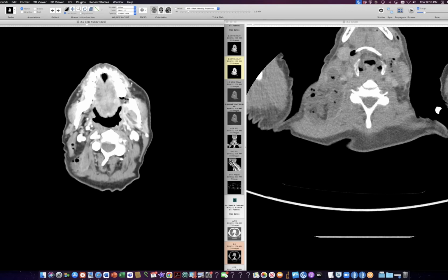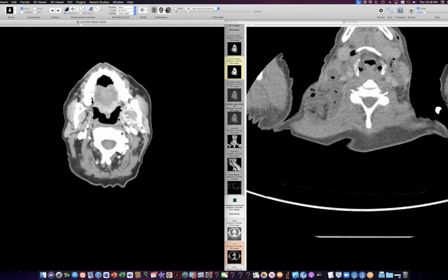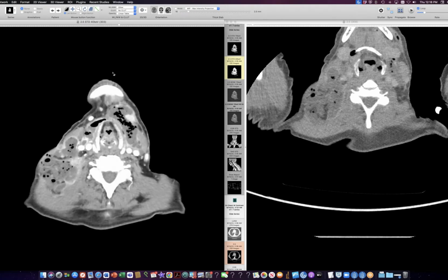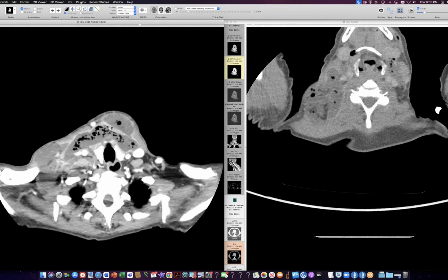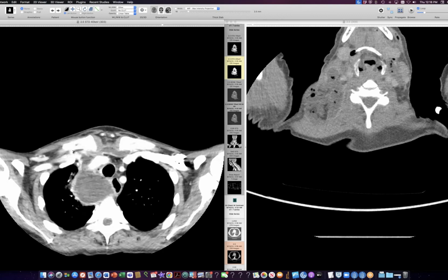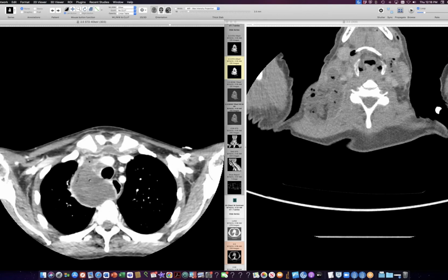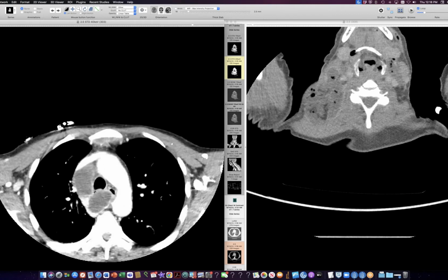So this person had an extraction on September the 2nd because of an abscessed tooth back here, and was given some antibiotics, which he said he took religiously afterwards, and then noticed some facial swelling, went to the ER, and has this extensive abscess throughout the neck, coming down the neck wall and chest wall here, and then coming down into the mediastinum as well.